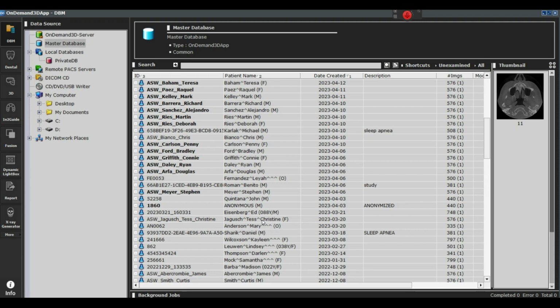Conebeam again. I've been putting up some videos of medial arterial calcification, or MAC, and showing you how to identify it and separate it from plain old calcified plaques, plaques being in the intimal layer and MAC in the medial layer, and MAC being more likely related to diabetes mellitus, either undiagnosed or uncontrolled. So I'm going to show you another trick today.